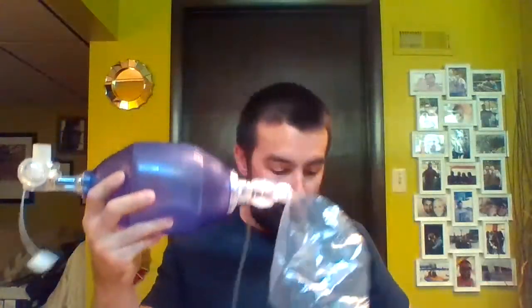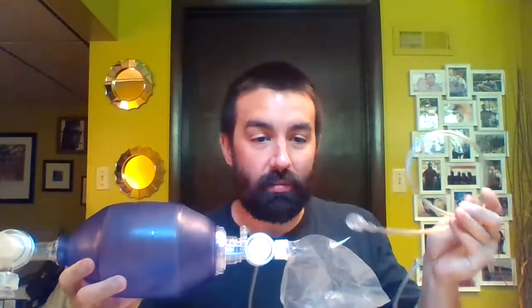All right, so manual resuscitators. Everybody thinks they can use a bag, all right? Everybody can, but it's essential to know some of the parts. This is a self-inflating resuscitator for an adult, okay? It gives a very, very large volume. You don't need to completely squeeze that when you're breathing for your patient. Keep in mind we're going to get chest rise.